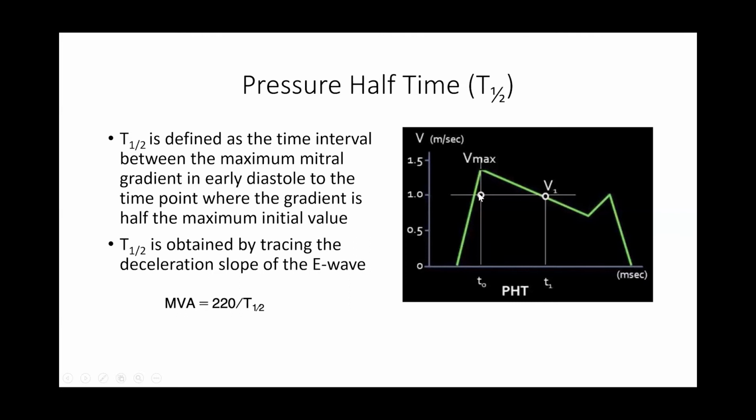And basically, you have E and A. You just need to trace your E wave, then you can get your pressure half time.